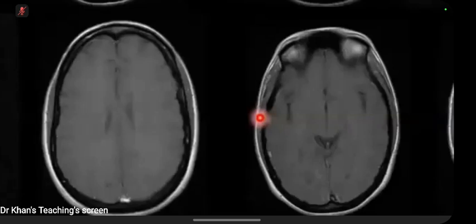contrast. Another criteria, of course, is to do a follow-up scan, in which you see a new T2 lesion, and you will say that it is a new lesion. But using contrast, you can diagnose MS on the first presentation, and that is a potential viva scenario. So, candidate 1, this is your case.